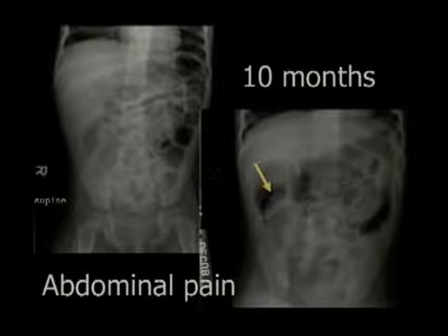Plain radiographs, I think, still have some role in looking at the child with abdominal pain. In this particular patient, not a grossly abnormal bowel gas pattern, but there are some slightly dilated loops of small bowel here. You have to get some sort of a decubitus film or prone image to get air to go up into the ascending colon. In this case, we see this rounded soft tissue mass, which is the intussusception.